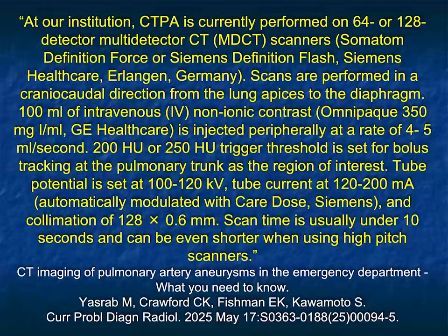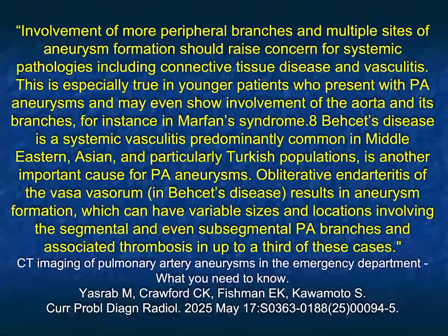Typically, we'll do 0.75 millimeter thick sections at 0.5 and 3 millimeter thick sections at 1 millimeter intervals. That works out very nicely. The scan time is under 10 seconds. We talk about involvement of the more peripheral branches and multiple sites of aneurysm formation.